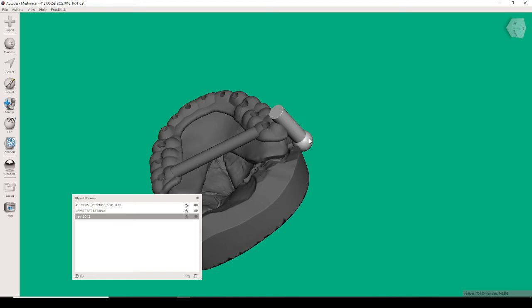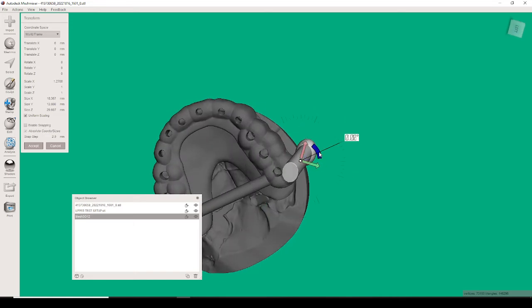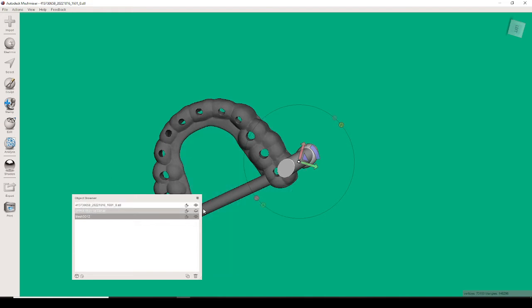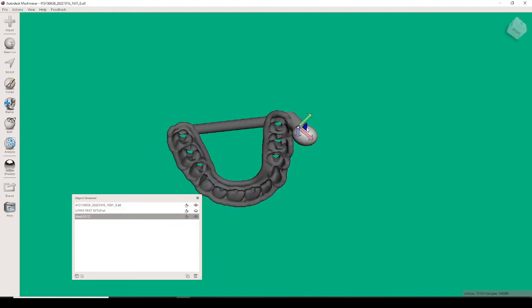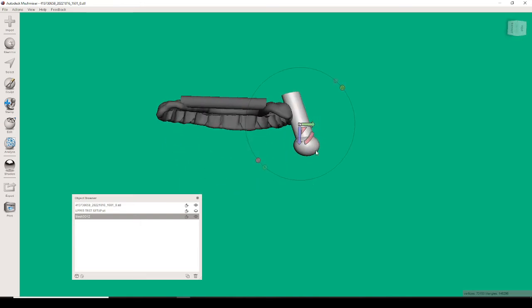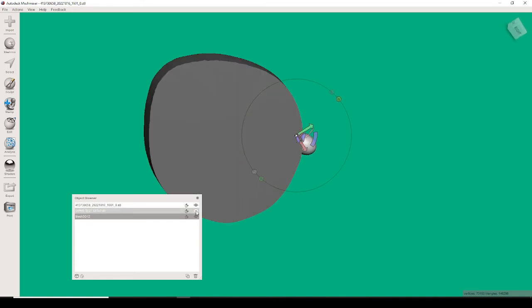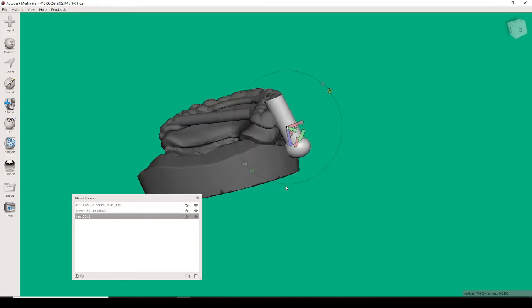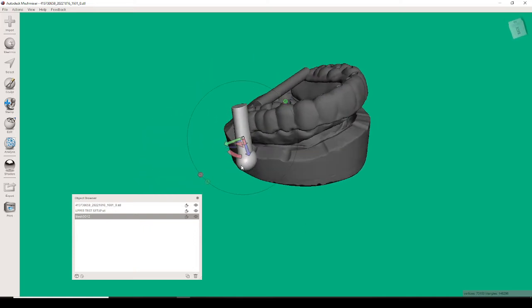Okay. Actually, let me adjust the thickness of this a little bit more and rotate it so it's not. Okay. Let's take a look here. No, it's too much. See, it's showing through again. Have to be careful doing this. That should work. Let's take a look. See. Yeah, that's good. I've got enough space here where it's holding everything in place.